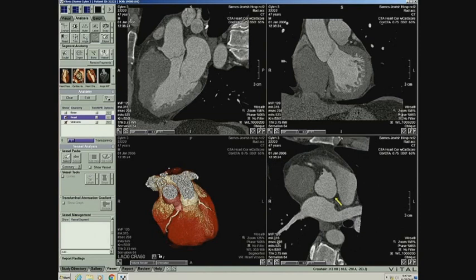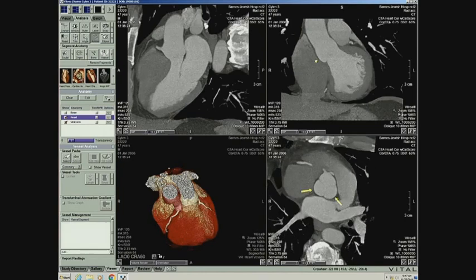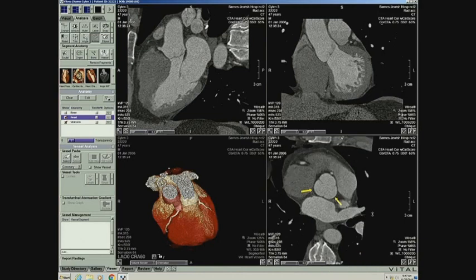But from the right, we see two arteries. One is going towards the right atrioventricular groove here. That is the right coronary artery. But there's another one traveling in this direction, in the opposite direction. So the question is, is this an intra-arterial course of the left main, or is this a septal variant? So I have to see, is it diving into the septum, or is it coming upward in between the pulmonary artery and aorta?